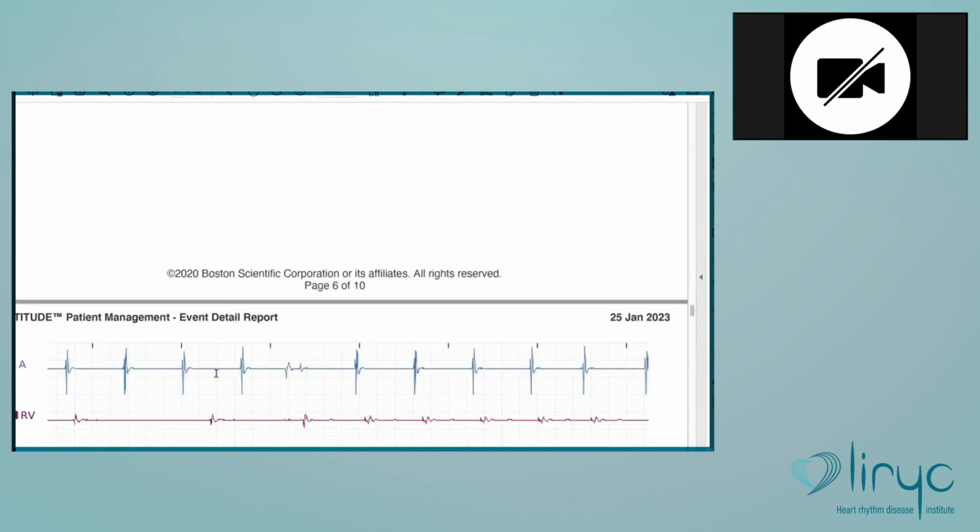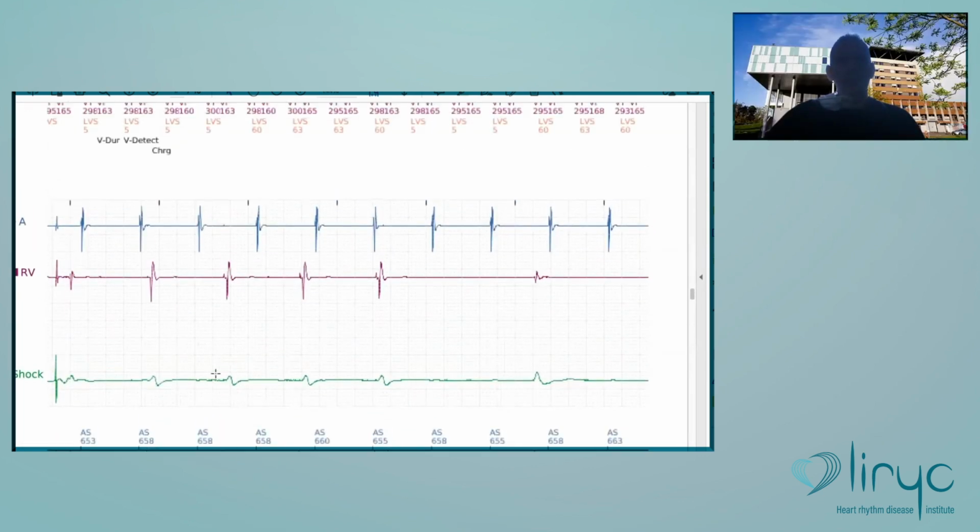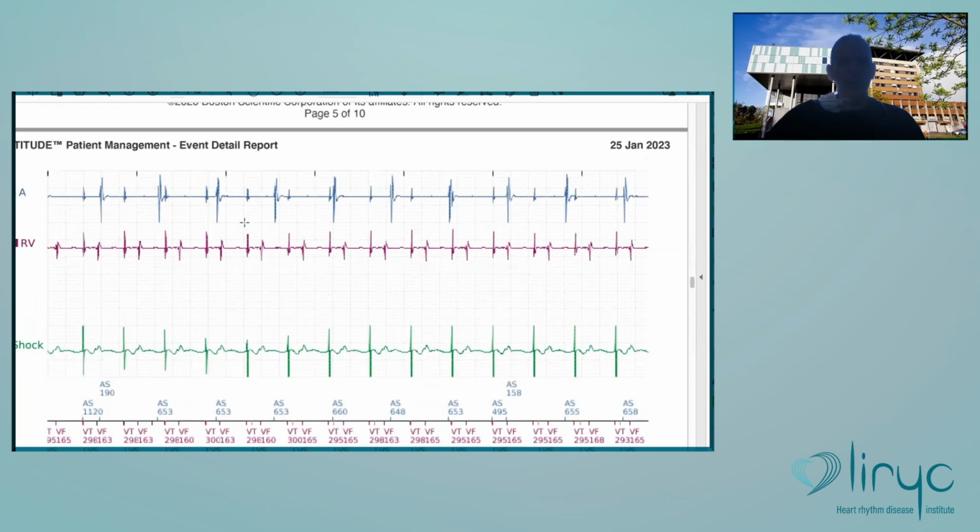So this kind of tracing is easier when you have an atrial signal, because you can see it now. Because if there were no atrial signals, maybe I could have thought this is the atrium, this is the ventricle, this is the atrium, as you said initially. You see? Yeah.